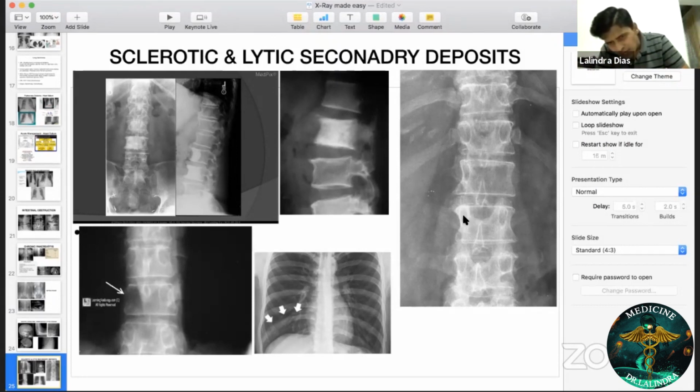Then here, yes, there's one eye here and the other eye here. There are two eyes here. But this particular vertebra, there's a problem. You know how to recognize. So two eyes, nose in center. This is called owl's eye appearance. So two eyes and the nose in center.